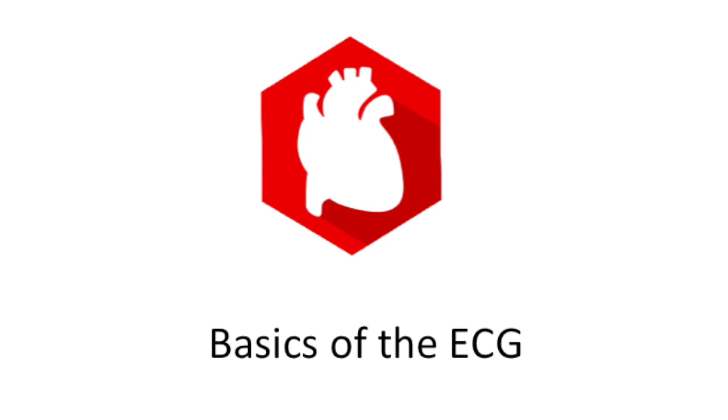What I will try to achieve in this video is to sort of pick up on some of the very common patterns that you may come across when you look at an ECG. So essentially, all I want to do with this episode today is talk about some patterns and how to read an ECG, how to sort of get the ball rolling. And I may have mentioned this in my last episode, but the value of the ECG comes in pattern recognition.